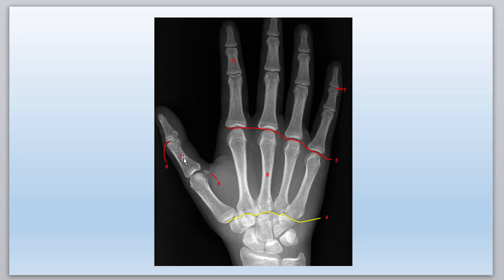2 phalanxes, which is not a word, then you call it phalanges. So these are the phalanges of digit 1. Okay, got it? So phalanx, phalanges is plural. So number 8 is the interphalangeal joint. There's no PIP and DIP here, right? Because you only have 2 phalanges.